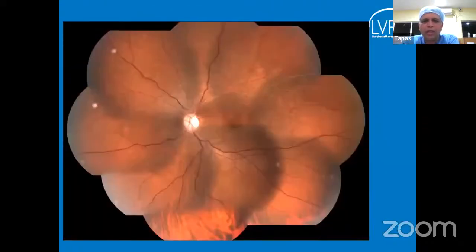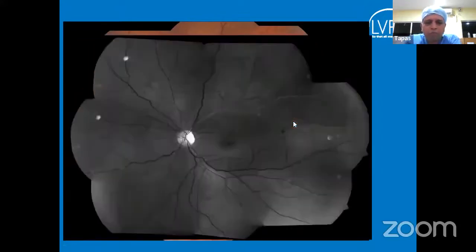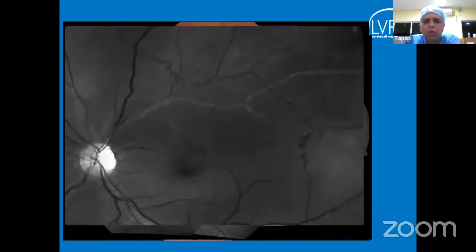Again, another example, the montage color fundus image, where we can see sclerosed blood vessels, corkscrew-like blood vessels here, and communicating blood vessels from the lower quadrant to the superior quadrant, and there are some lesions here which we are not sure what they are. If we do the red-free imaging, you can see that the lesions are much more apparent and clearer. But again, to get a deeper look, one needs to magnify.